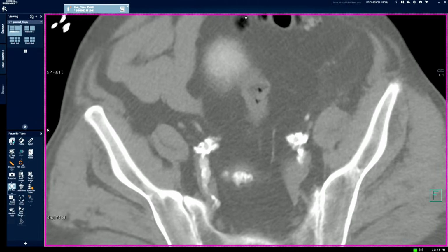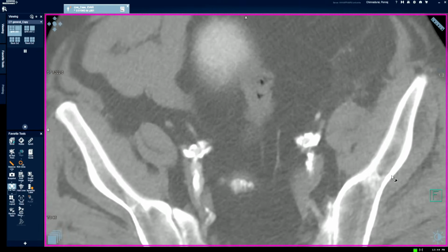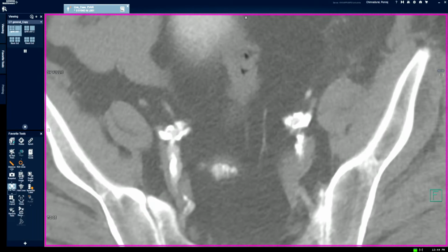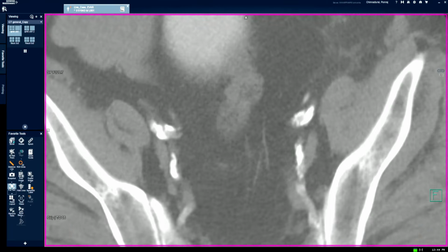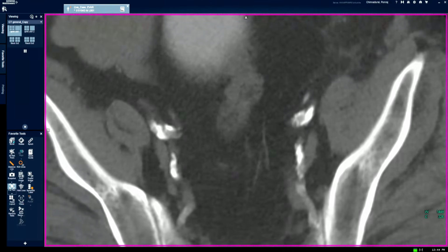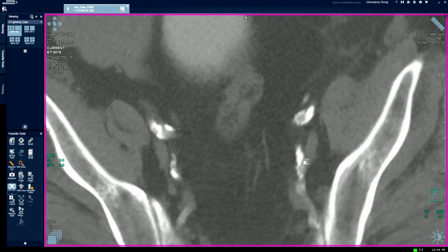Okay, I'm going to stop here and ask, how many of you saw the stent in the left iliac? Anyone saw the stent in the left iliac? So this is another reason why we have to do the right windowing. For example, I was kind of focusing on the calcification. So here you see the calcification and the stent both have the same attenuation values or Hounsfield unit assignment. So now when I window this, you still see it, but it's not very clear, right?